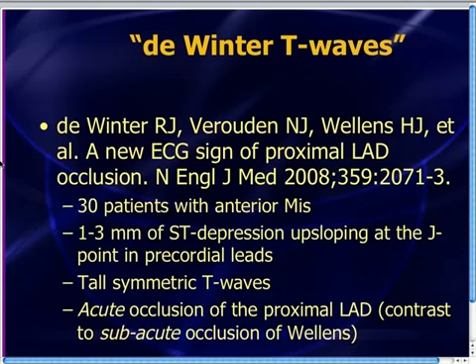Now, let me put a disclaimer in here. This is not currently part of the national guidelines, but more and more people are starting to talk about these Dewinter T waves as essentially a STEMI equivalent. Now, don't call your cardiologist at 1 o'clock in the morning and tell them they've got to come in for this.